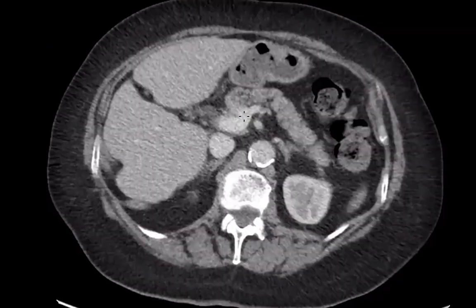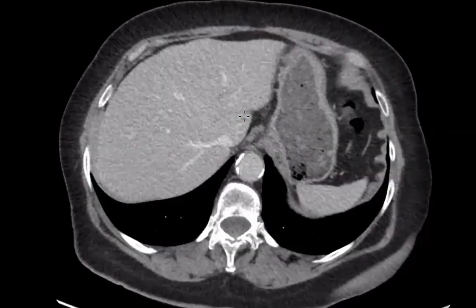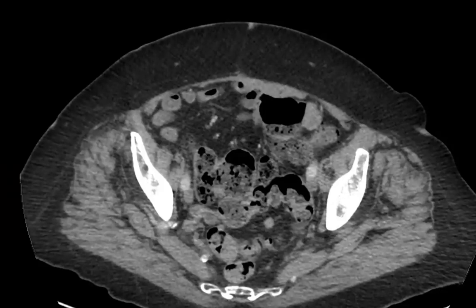To see if it's enhancing or not, you need to check the pre-contrast, not the arterial phase, because some of the lesions are hypovascular. So if you want to see if it's enhancing, you need to check the pre, and then arterial, and then portovenous to see if there's any washout. And this is how you find what the lesion is. Perfect. Good. Thank you very much, and well done.